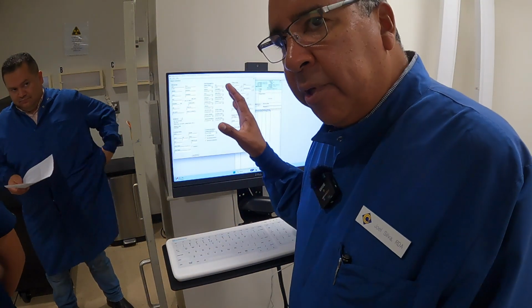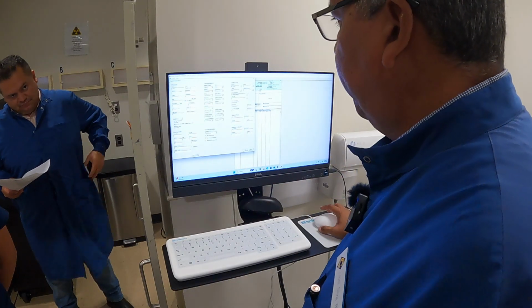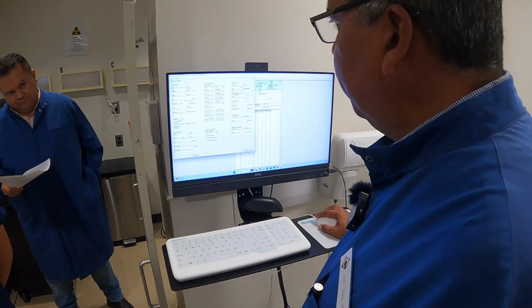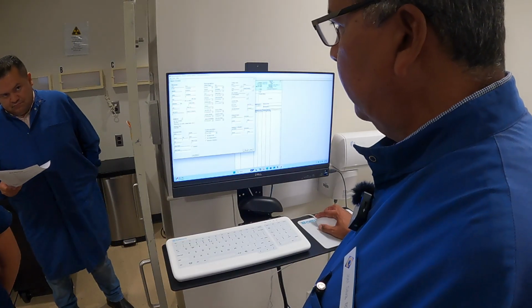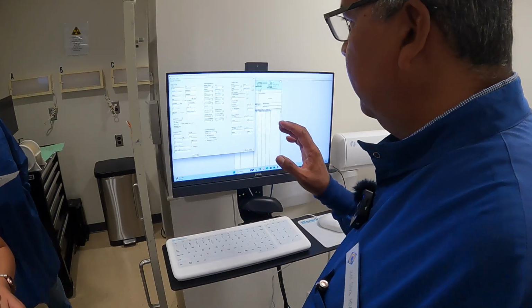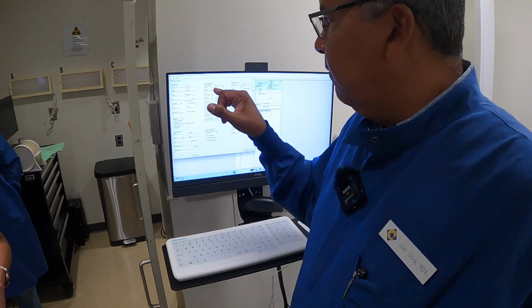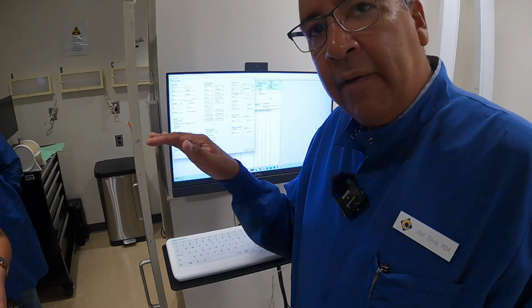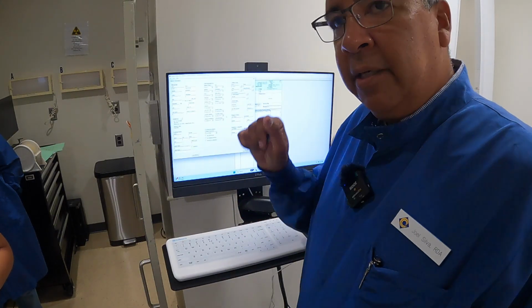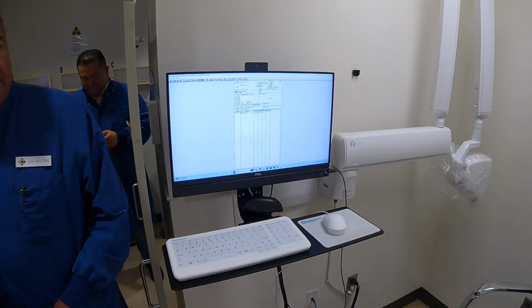That's all you have to put in there is bite wings, bisecting, for your patient's name, and then if you want to, just for entertainment purposes, you can change the sex of your kid and put that on there. So everybody go ahead and add a patient to yours. First name, we're all going to have the same kid's first name. Bite wings, bisecting, okay. Let's see. Okay.